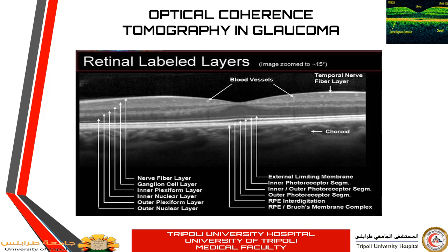As usual, before speaking on the OCT map or anything else, you should memorize this image that gives you the histological appearance of the retinal nerve fibers, the clear and very high resolution of the image, and the different thin layers of the retina, starting from the nerve fiber layer, ending up with the retinal pigment epithelium and the different nuclei.